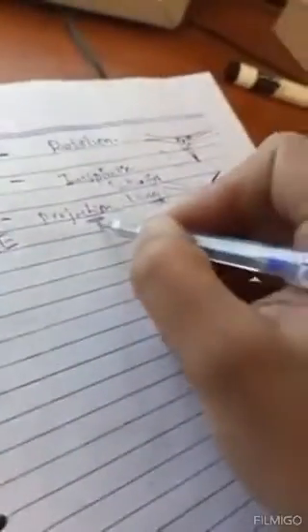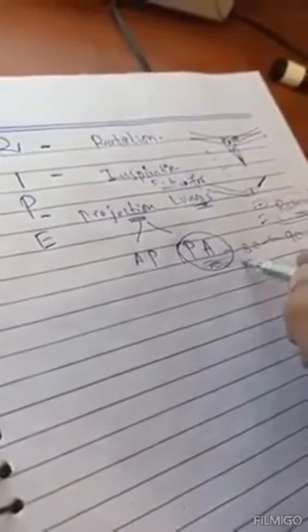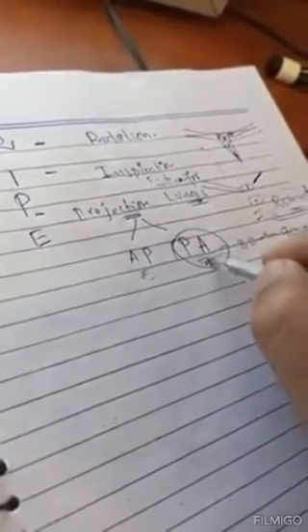Comment on the projection, right? What is meant by projection? Projection means there are 2 types of projection in a chest x-ray. One is AP view and one is PA view. Commonly, for 80 to 90% of x-rays, we use PA view, right? Mostly if the x-ray has not mentioned AP view, it means that this is in a PA view.